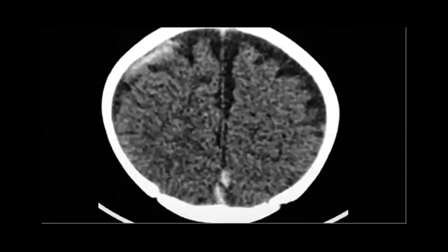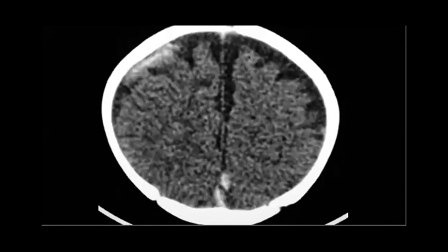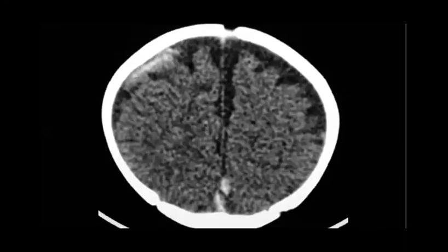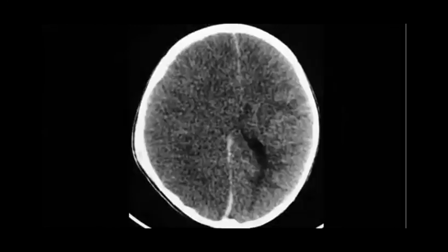And when you find something like this, how do you describe it? Subdural hematoma. You can see the high density or fresh blood density, and also you can see something here. Yes, interhemispheric, perfect. Interhemispheric fissure in the posterior aspect. So subdural hematoma. Non-accidental injury in any exam is very, very popular. They like it, so be prepared that you will be asked about it.